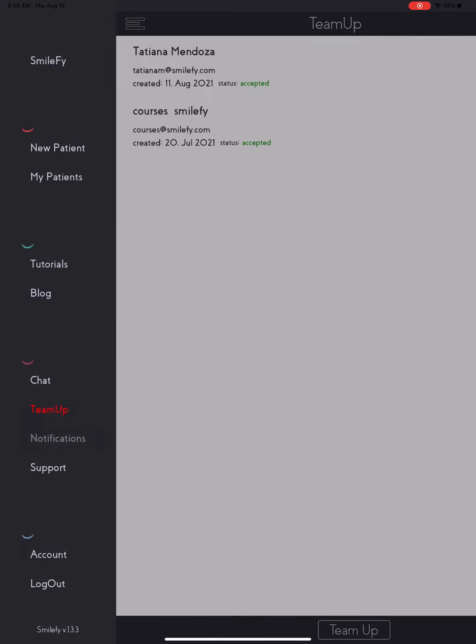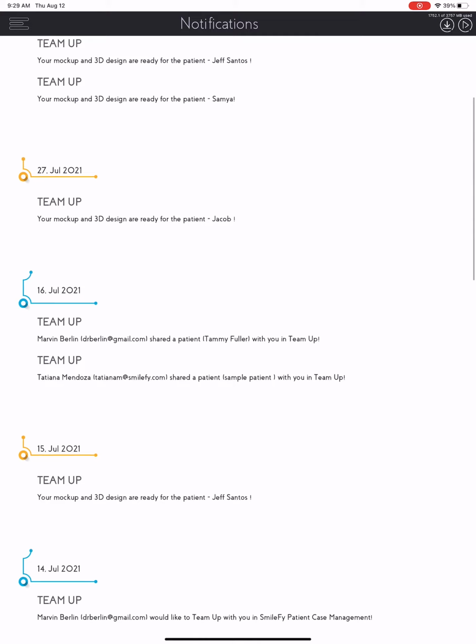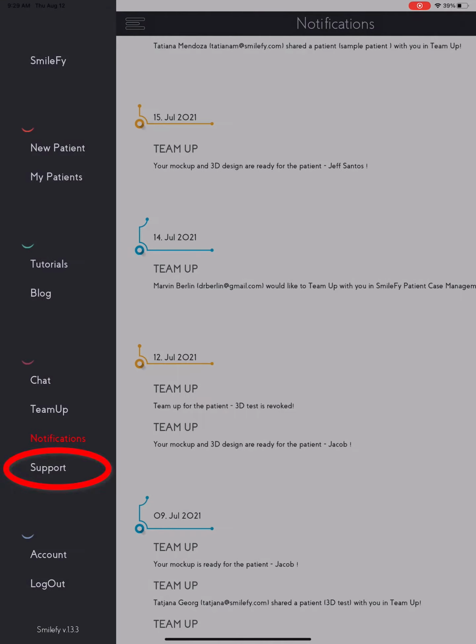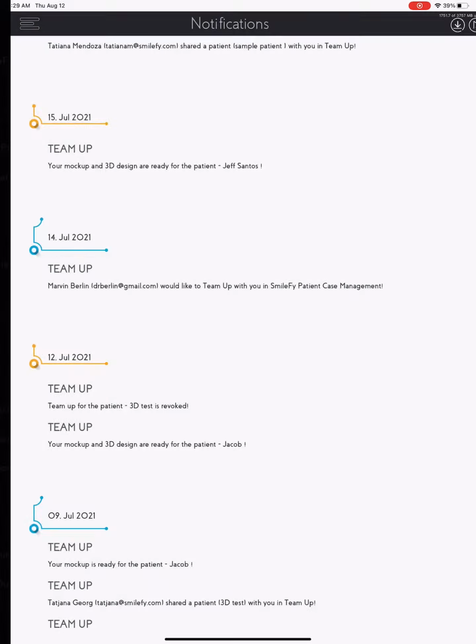Under Notifications, you will have the history of your actions, such as sharing a document with another member or receiving a 3D design sent to our design service, Design for Me. If you need help, click on Support and send us an email or a message via WhatsApp or text message.